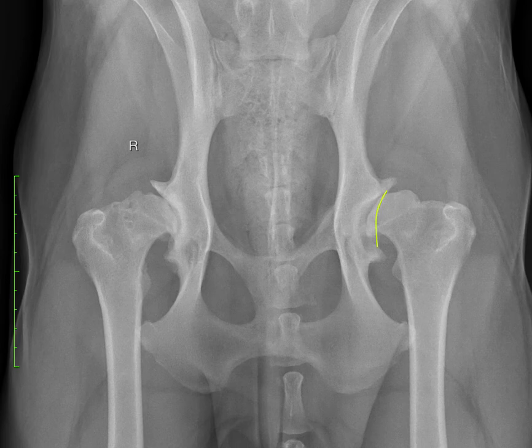After coverage, I look for congruity. Congruity is that sense of, is the shape of the femoral head matching the shape of the contour of the acetabular cup? Well, as you can see, the femoral head is very sort of blunted, and the acetabular cup, it really barely qualifies as being rounded. It's almost flattened. So in this case, our congruity is also very poor. Another way that I look at congruity is I look at the radiographic joint space, and you can see that it's not uniform, and in fact you could even argue that it gets quite narrow in some places.